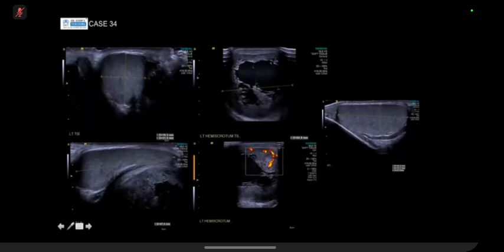So what would your concern be for this within the testicle? No history of trauma, clinically well, just complaining of swelling, and has a solid cystic area with flow in the solid components. It could be a neoplasm, a malignancy. Yeah, so this is a case of rhabdomyosarcoma in the scrotum. So it's quite a difficult case.